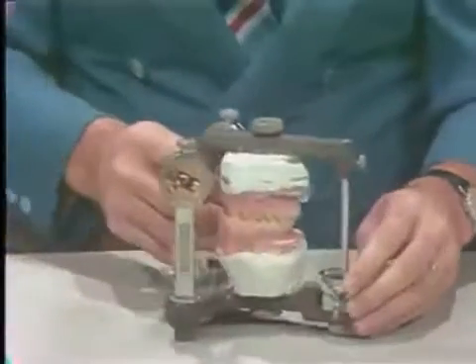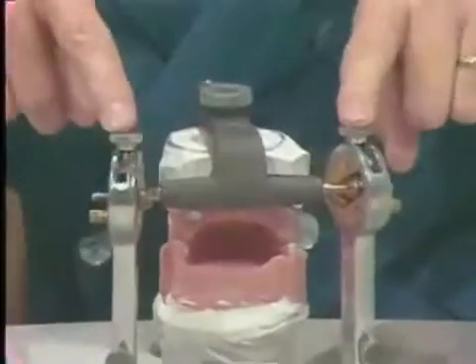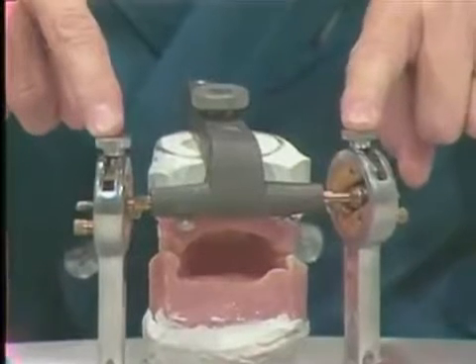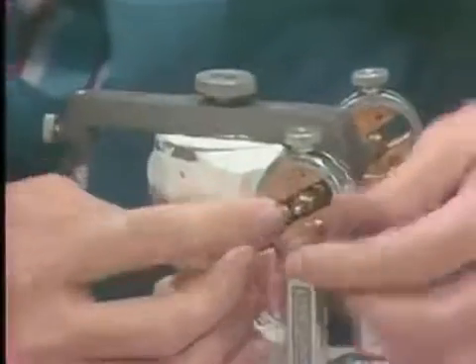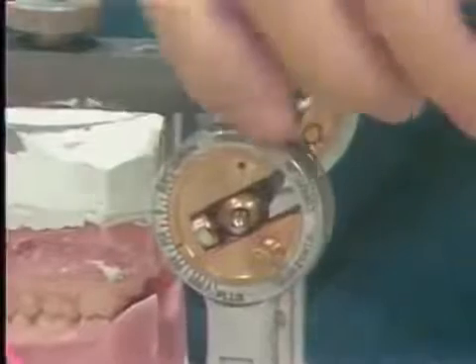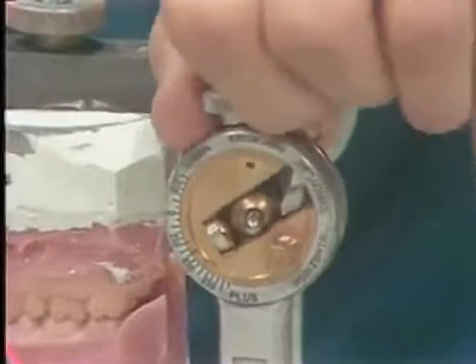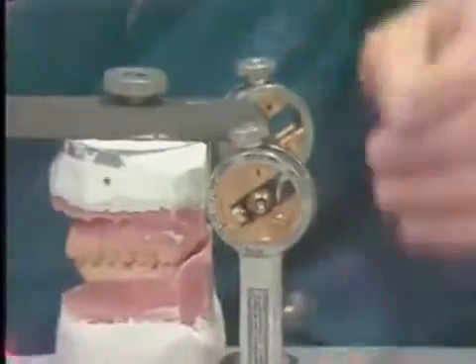The other thing that we want to talk about, and we're pointing from the back, is that you have a fixed intercondylar distance, which is an average intercondylar distance. The angle of eminentia relates to the condylar element, and this is adjustable, so we have this adjustment on it, and that relates somewhat to the anterior slope of the glenoid fossa.